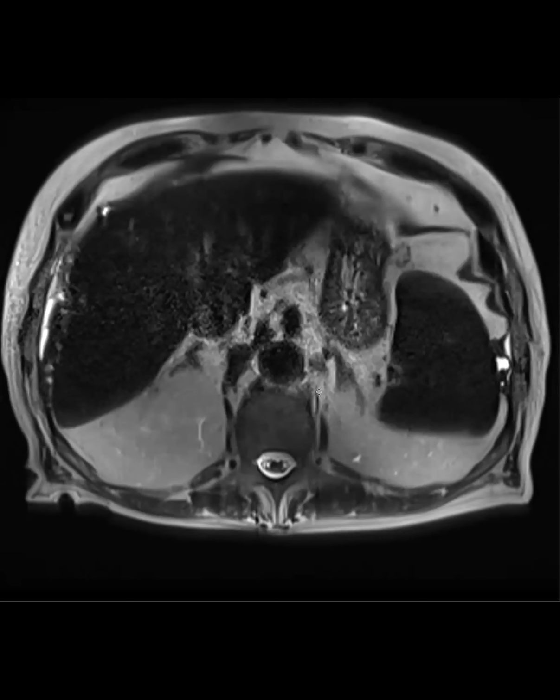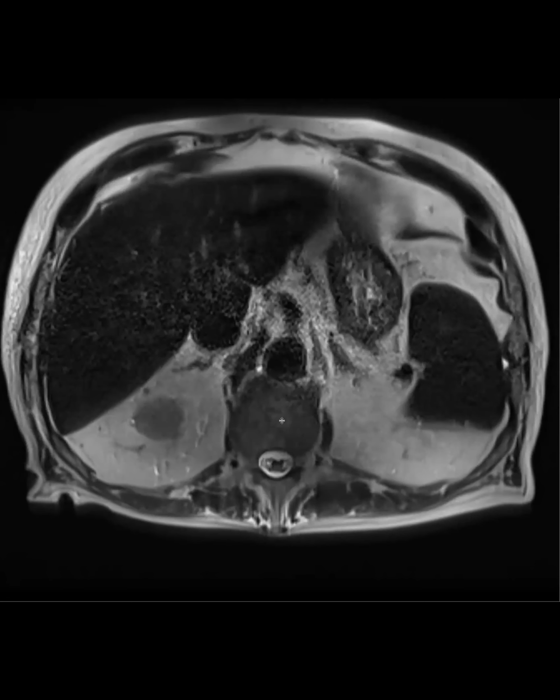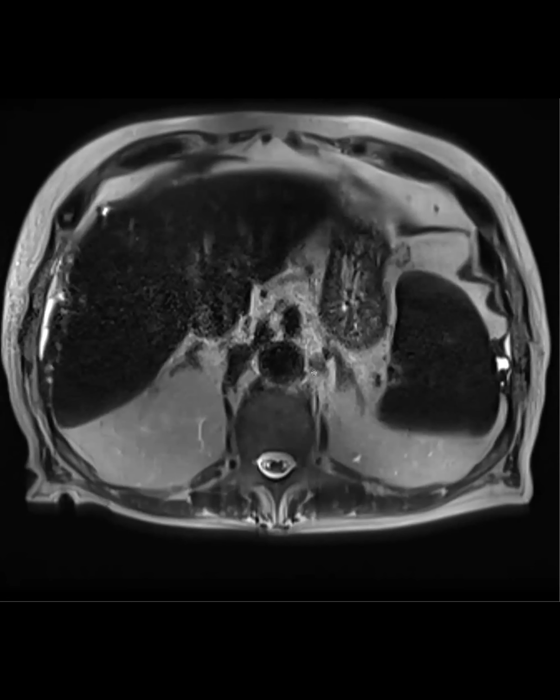Anyone in the chat? I have a guess. Do you think it's a lymph node or not a lymph node? Let's start there. Could this be the celiac axis? Yeah, that's my thought too, celiac ganglion. Yeah, so this is the celiac ganglion.